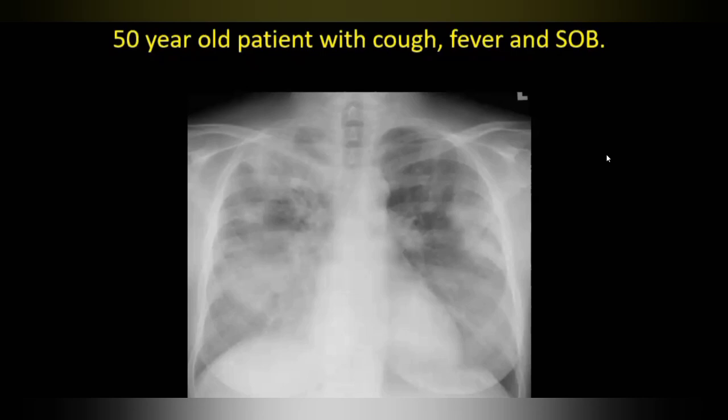So my likely diagnosis would be some infective etiology. Some infection in which there is also cavity formation, like Staph aureus maybe. Now, in your practice, if you see this appearance, what is the first thing that comes to your mind? What kind of infection should come to your mind immediately?